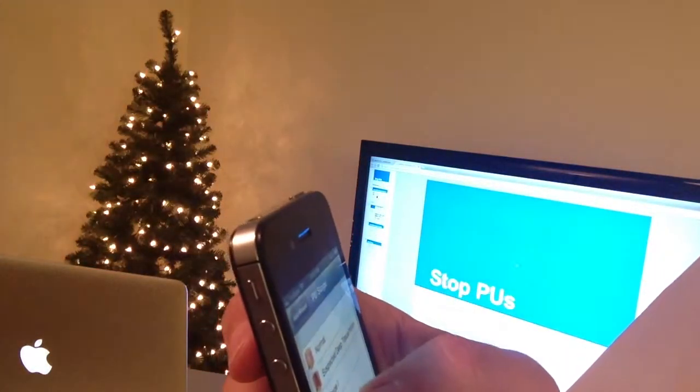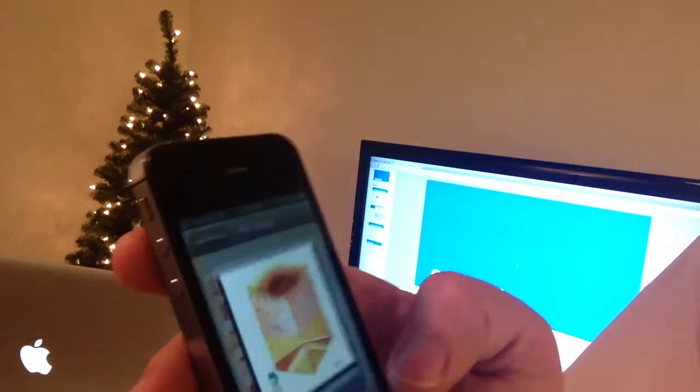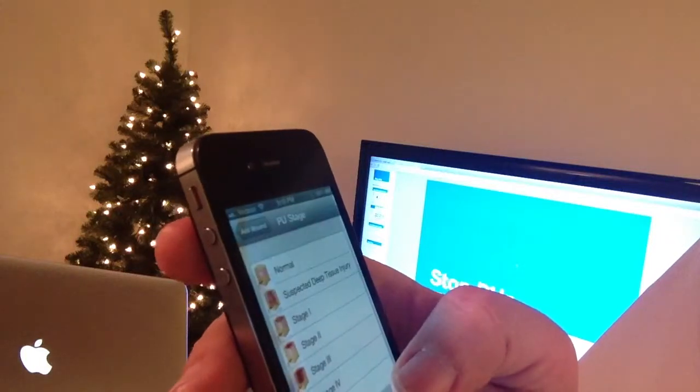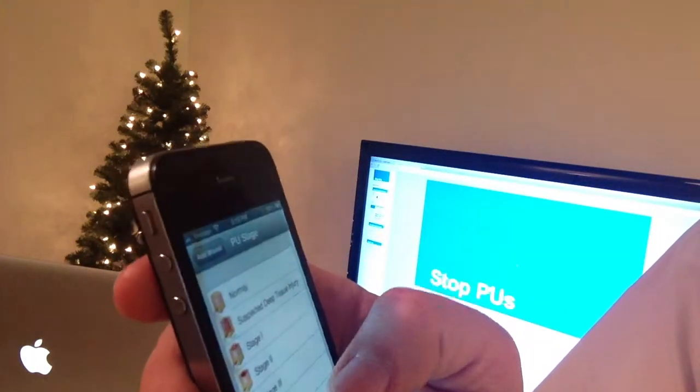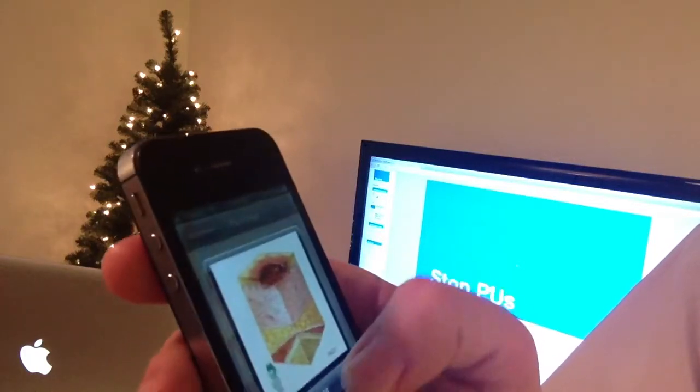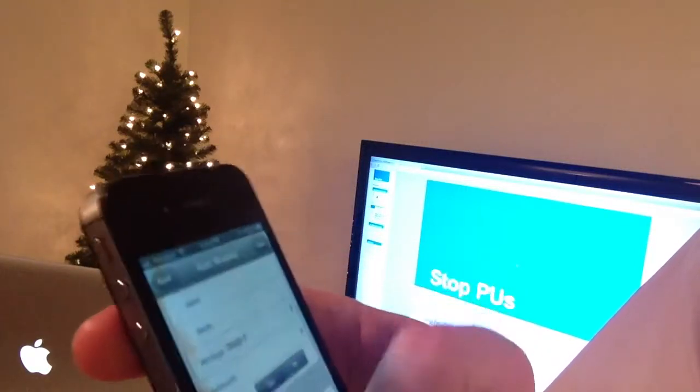So at this point, we can actually review the different pressure ulcers from the NPUAP. And we'll say that this is a stage 2 pressure ulcer, and we can determine whether or not we want to go ahead and add additional details to the wound.